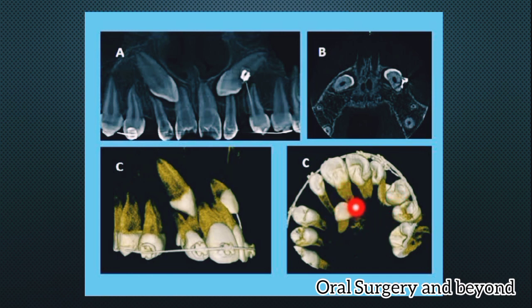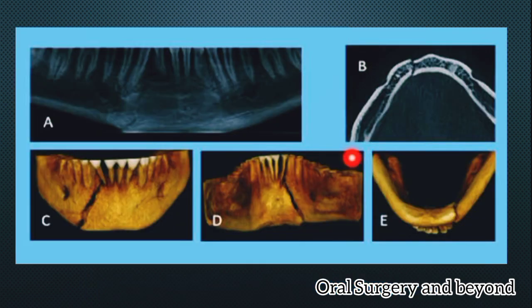Here we can see the tooth is more palatal compared to the buccal side. Here is the CBCT of a fracture of the mandible, right?